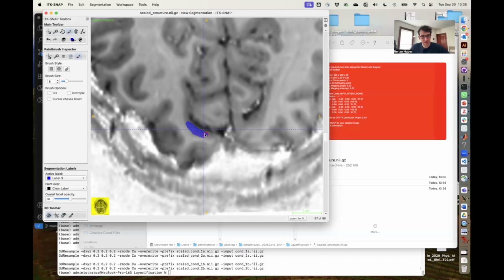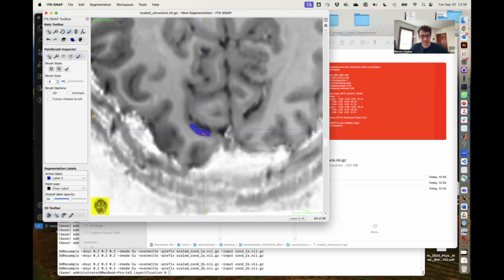There are drawing tablets that allow you to basically draw directly on the screen. Very often, I don't really bother, depending on how large the ROI is. Also, you need to be trained a bit on those drawing tablets as well. There are some wizards that do this very, very well. One of them would be Faruk Gulban. There are tutorial videos on the Let's Analyze video series for LayNii, where he goes through this and his setup and the recommendations that he has for manual segmentations. I usually just take the mouse because it's fast and easy.